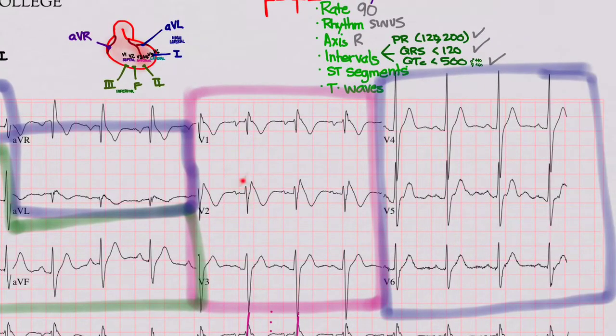Here we have some funky looking ST segment. Look at this shape here. Now this shape is why I put this EKG in here. This is called a Brugada shape, Brugada syndrome, or a saddleback shape. These patients who really have this have a high risk of having sudden death. And so that's why it's important to know that. Though this shape has to be in the presence of a clinical syndrome that makes you really worry about it.